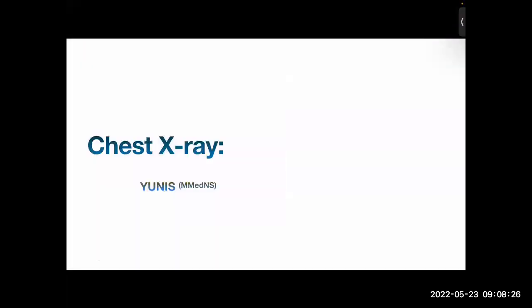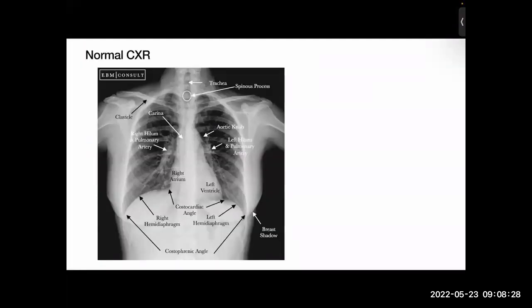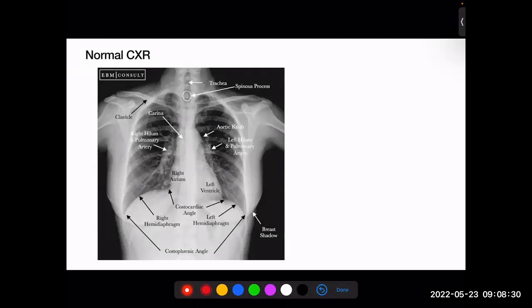Bismillah. So we start with a normal chest X-ray. When you're looking at a chest X-ray, there are chest X-ray anatomies that you must look at, and then there are chest X-ray terminologies that are important. So we start up here.